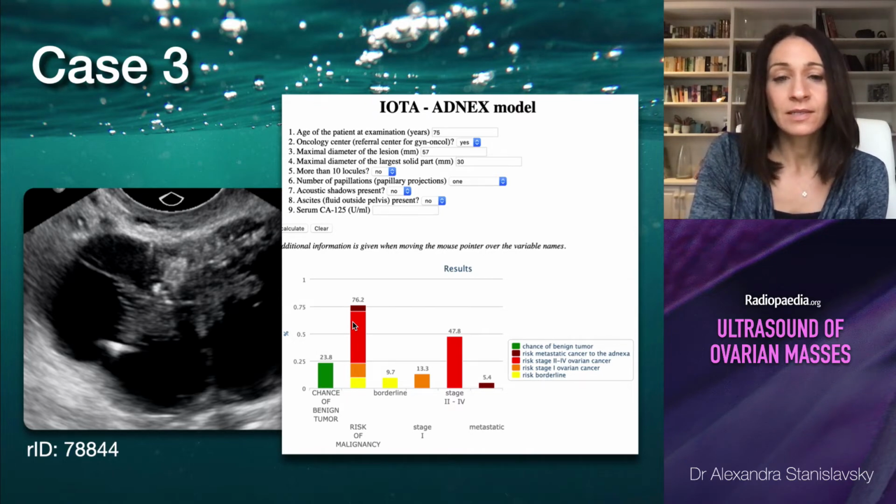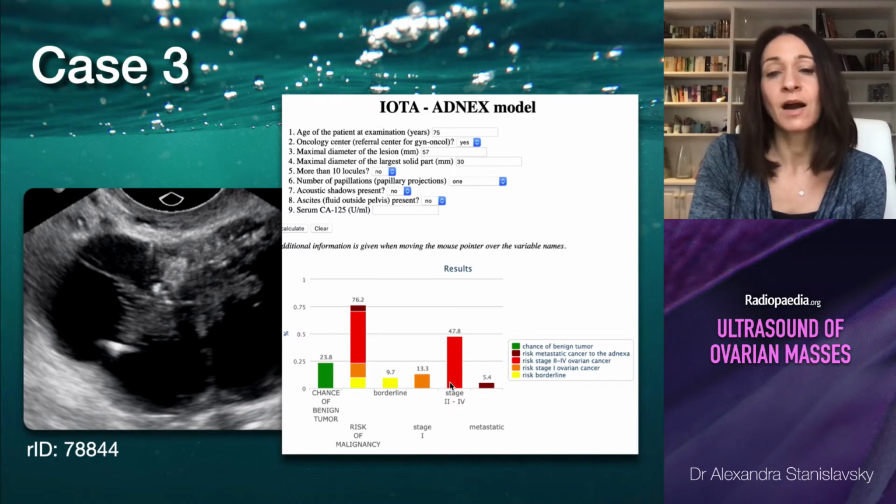This is very likely malignant. And if you look at the breakdown, we're concerned particularly about a high-grade primary rather than a borderline or low-grade.